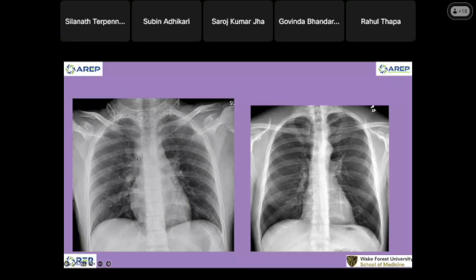The lung volume is not big. The EG junction looks a little bit prominent above the diaphragm, and then the stomach may be a little bit up. The pulmonary vasculature is prominent. The heart doesn't look so big. This is the stomach; we see rugi. So the whole thing is the stomach above the diaphragm. This is an example of hiatal hernia that you can see.